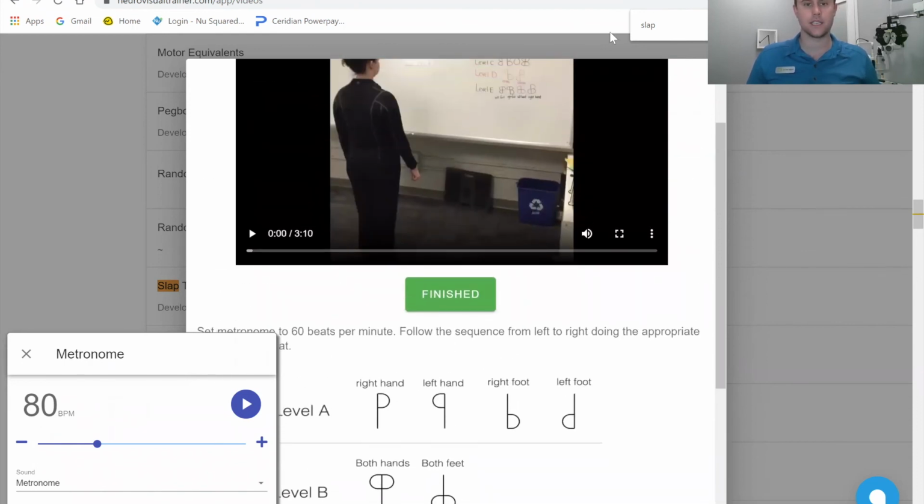Some of these activities can be seemingly a little bit abstract. So it's nice to take away that instructional time and spend more time on the particular activities. So we really enjoy this feature, as I'm sure many of you listening do as well. We use this activity all the time. So I just wanted to demonstrate just how simple and easy it is with their software.